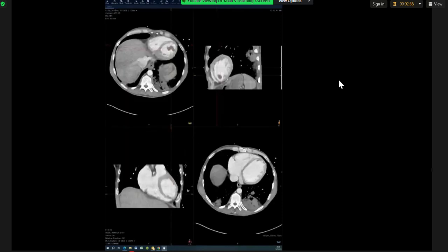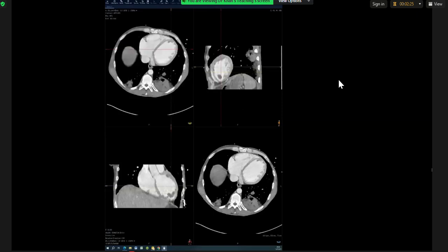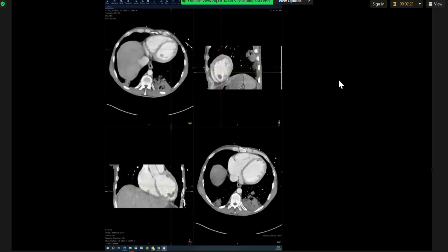So what are the infarcts then? Could this thrombus be throwing off microemboli and causing infarcts? So what are you concerned about in the patient's history? What is causing the thrombosis? What causes of thrombogenesis or increased risk of thrombus?